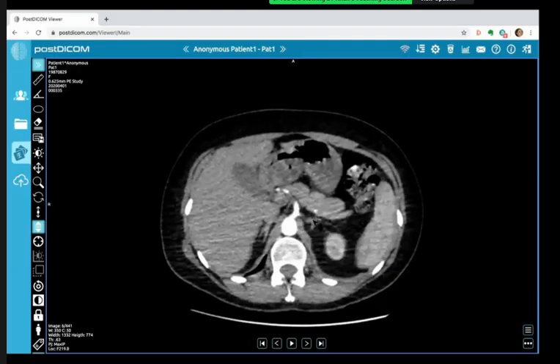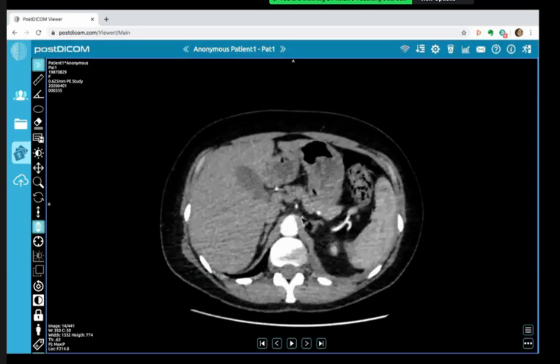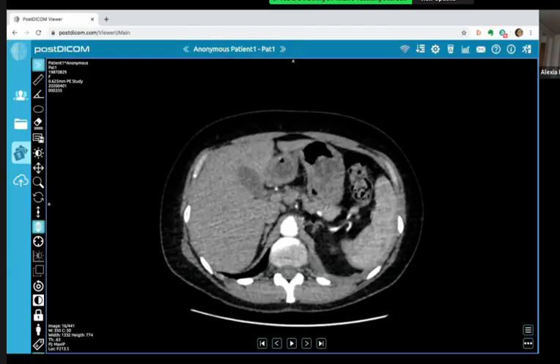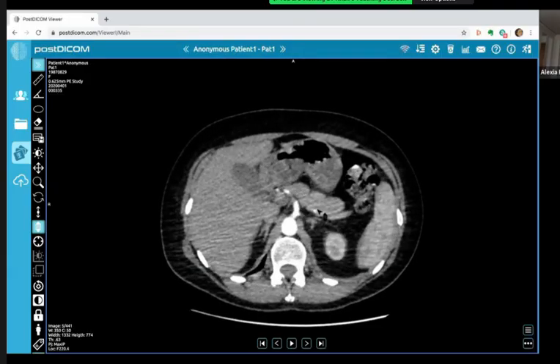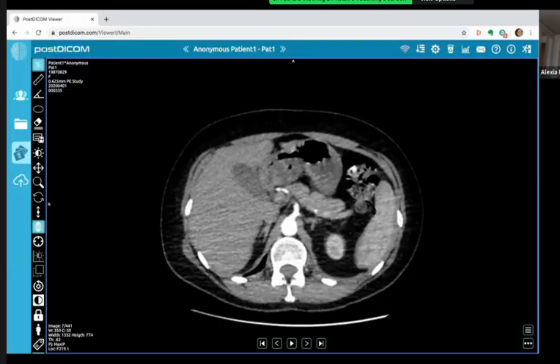Okay, so it's coming off of the SMA. The celiac, actually. Celiac, apologies, yeah. Okay. So you couldn't tell because you didn't know there was a celiac coming off above it. Yeah. This is the celiac trunk. Yeah. Yeah, so it's coming off the celiac trunk. So I've got a lesion that has got systemic arterial blood supply as opposed to pulmonary, which would be in keeping.